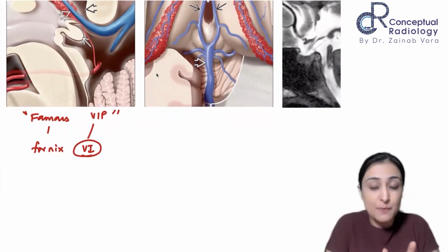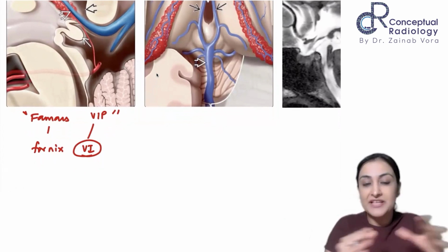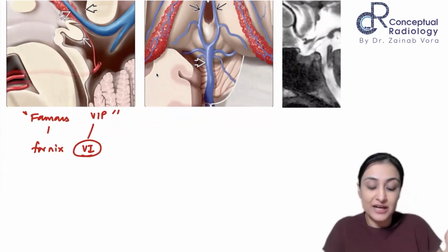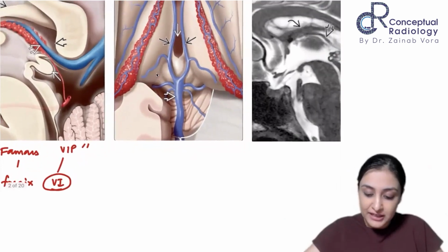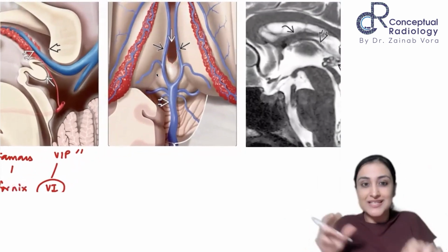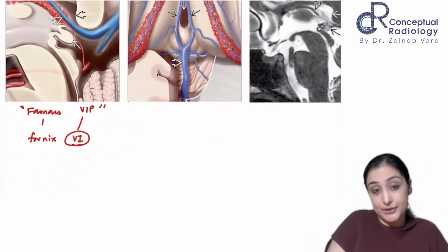It's actually a space, right? I'm sure you know, a cavum velum interpositum can also form if there is expansion and it's filled with CSF. That's what we call a CVI, just like how we have cavum septum pellucidum. Just like the septum pellucidum, it's this invagination. In fact, if you look here, this is that fold that you can appreciate. This is that invagination of the pia mater, that is the velum interpositum.